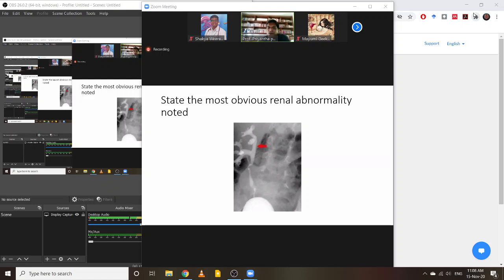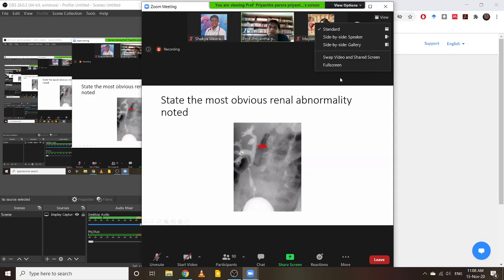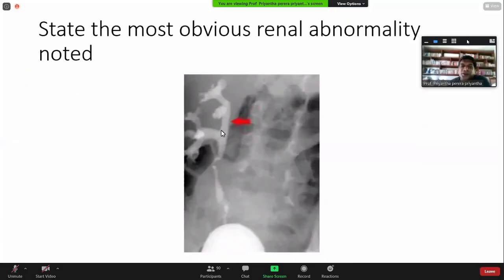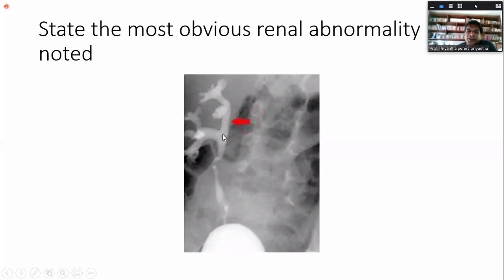You can have what you call yo-yo movements, like the toy yo-yo. A yo-yo movement can occur between this part of the bladder and the kidney, so the urine might just pass back and forth without going down. That will cause stagnation of urine and increase the risk of urinary tract infection. So a duplex system can also lead to recurrent urinary tract infection because of stasis due to yo-yo movements.